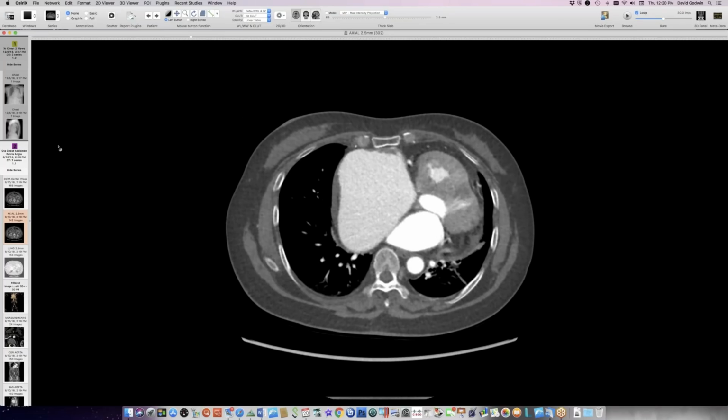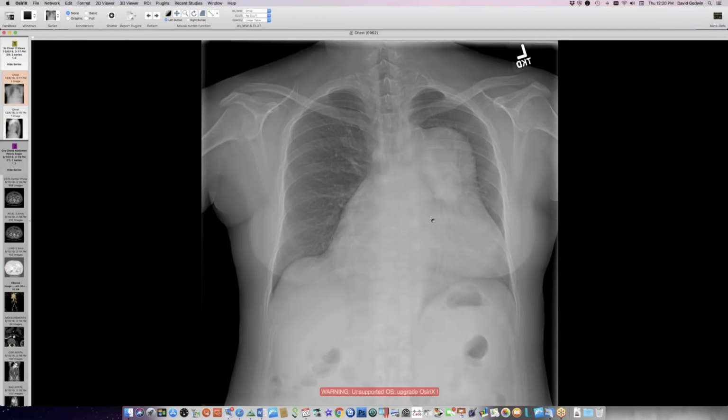So very dramatic, untreated rheumatic heart disease, and the unusual feature here is the pulmonic involvement. On echo, she had pulmonic stenosis and regurgitation. I think the regurgitation contributes to the incredible enlargement of the main and left pulmonary arteries. So with regurgitation, with a volume overload, you often get more dramatic dilation than you do with just a pressure overload. She had both. Okay. So, not a normal chest radiograph.